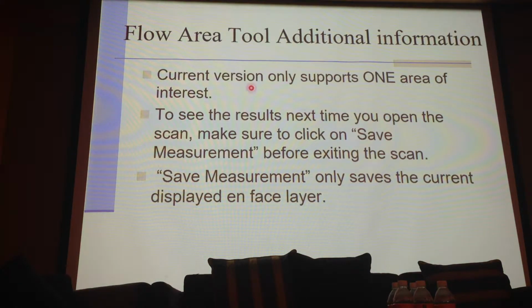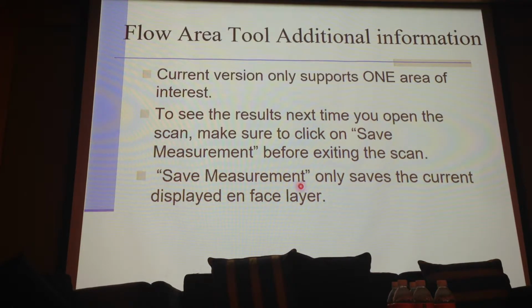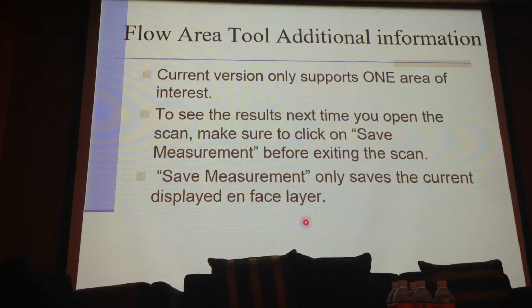So right now we support one area of interest only, and we need to make sure we click Save Measurement. The Save Measurement button only saves the currently displayed layer. So one layer, one measurement so far.